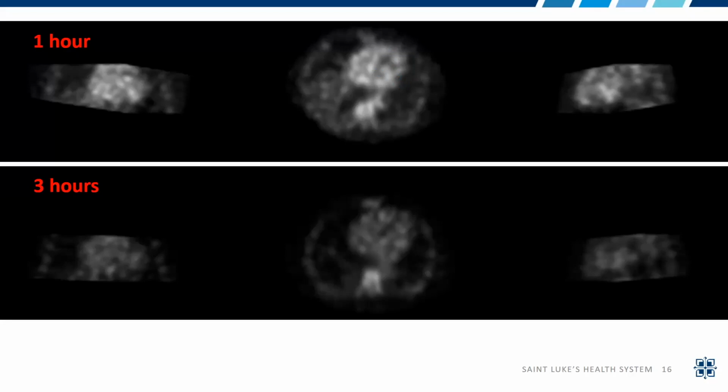And oftentimes it's easier to see that on the 1 hour image because there is more blood pool, or there's less bone, less rib. And so you visually see more blood pool. So you can see this donut of the heart or this horseshoe of the heart that's a negative image. This is maybe not the best example here, but you can see it both on the 1 hour and 3 hour, but sometimes it's actually a little bit easier to see the negative study on the 1 hour. If you are not looking at the hot spots, but you're looking at the cold spots, you're looking for the negative outline of the heart to tell you this is a negative study.